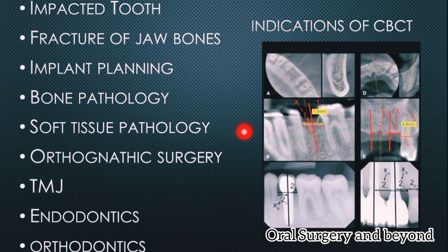So what are the indications of the CBCT? The most common indication for CBCT is diagnosis of an impacted tooth and its location. Whenever there is an impacted tooth, whether it is an impacted canine, impacted premolar, supernumerary tooth, or even a wisdom tooth, if we have to locate the exact position inside the jaw, we have to do a CBCT.